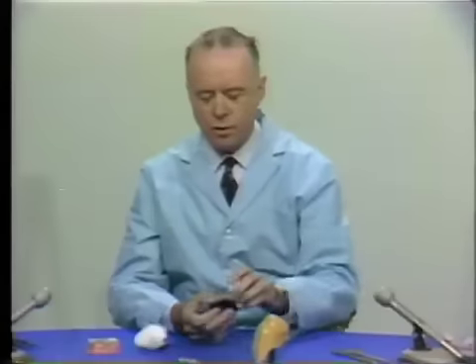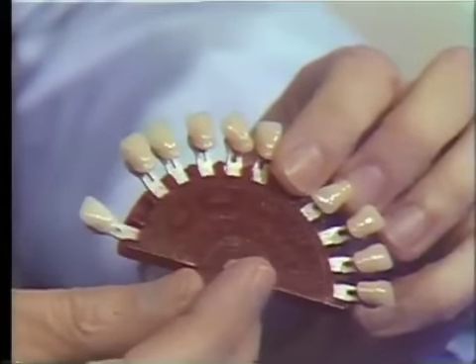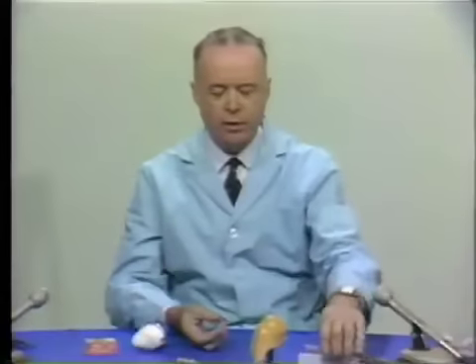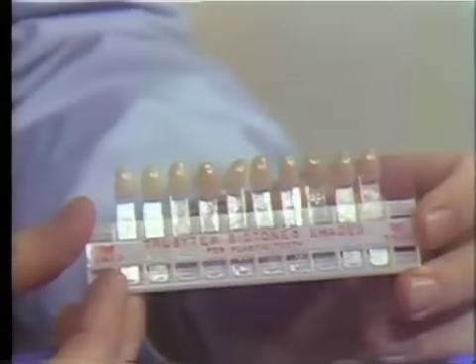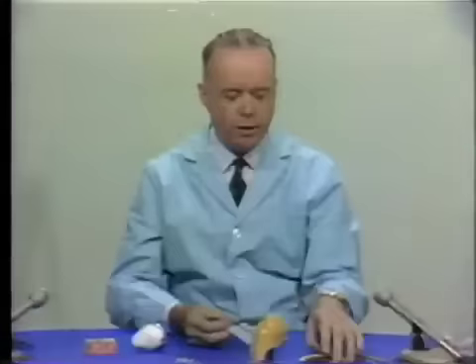Now, these facings are made in regular porcelain, and in selecting those, one uses the same new hue shade guide that you use for a regular porcelain in the Steele's flatback. A few molds, however, have been made recently in resin facing, and these are particularly suitable in repair situations. In that case, of course, you use the biotone shade guide in selecting a shade for the resin facings.